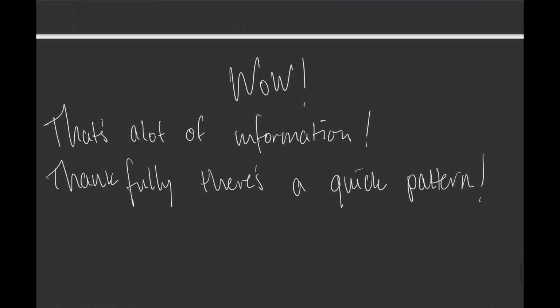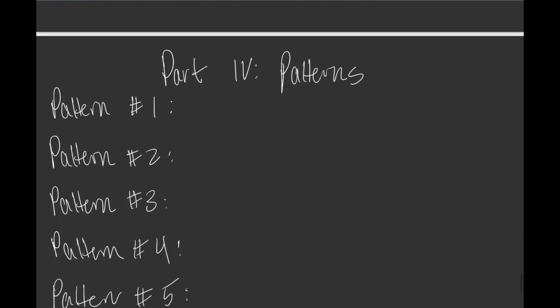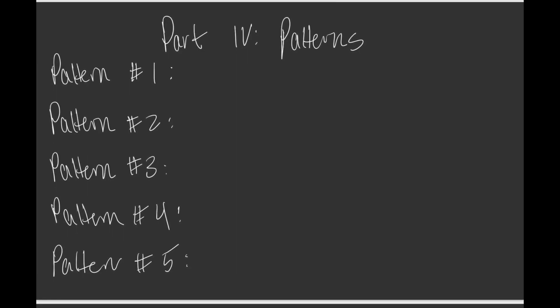So wow, that's a lot of info. It almost seems like for every complex, and there's 12, we have to know each one of the bits and pieces about what each one of these 12 things should look like. Now thankfully though, since this is a pattern recognition video, there is a little bit of a pattern that we can start to discern in all of these rules. So there's a 5-step pattern recognition to just figuring out at a quick glance if there's anything going on with your 12 lead.